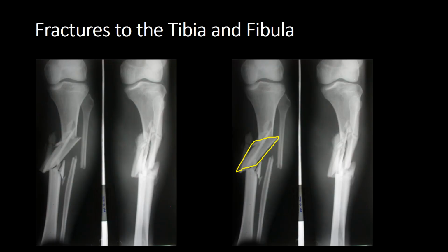So when we talk about a comminuted fracture, this is what the surgeon wants to know. There are multiple large fragments of bone. If you ever see a fracture where you have teeny tiny osseous fragments, then what you could describe that as is osseous debris. And that gives the surgeon a very different impression of the type of injury. A comminuted fracture is something that's very, very important because it makes fixation so much more complex.